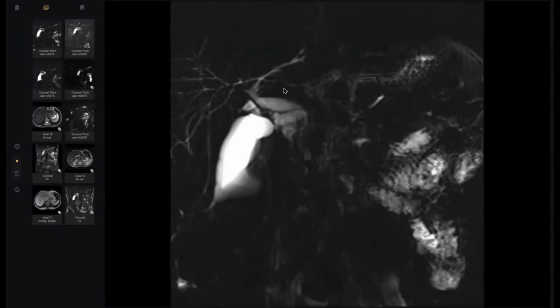This patient has abdominal pain. A 45-year-old patient with abdominal pain. Request control, please. Go through the images, please. This is the MRCP images of a middle-aged person with abdominal pain. I'm not able to scroll. I think it is a static image, so you can do it.